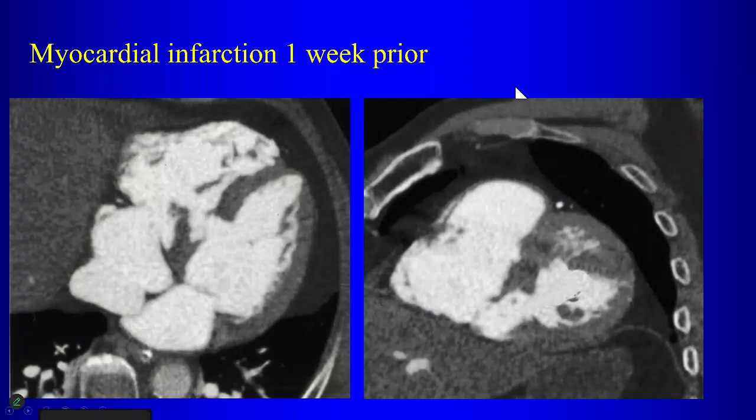Ventricular rupture. Yeah, so this is rupture of the interventricular septum, which is another complication that can occur from acute myocardial infarction. Okay, this also can result in pulmonary edema and failure acutely because of the rupture of the septum. So this is not tolerated. Acutely, it's not well tolerated at all.